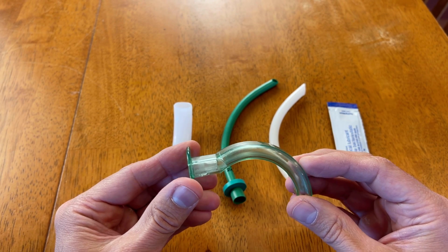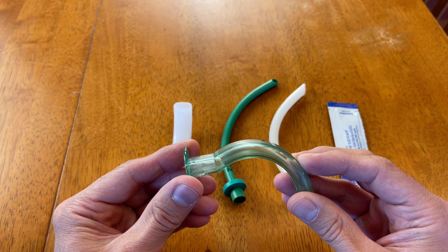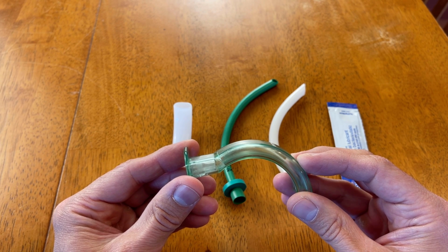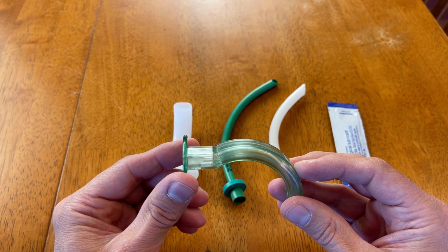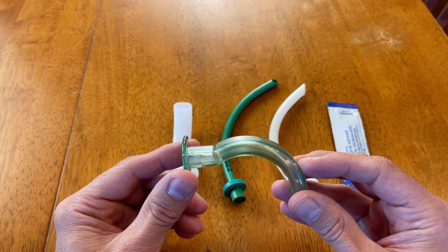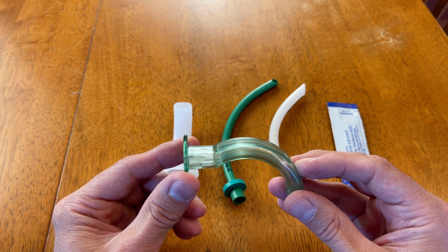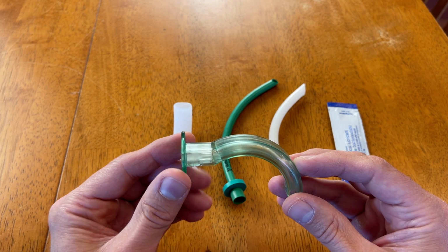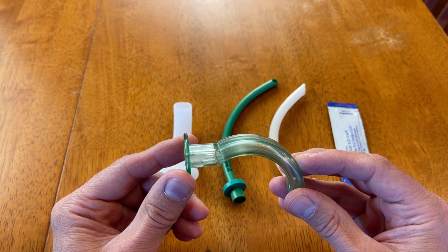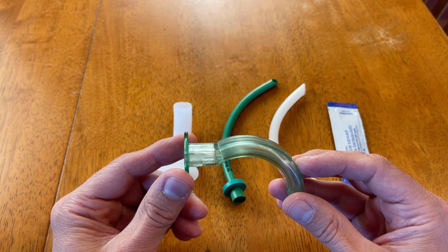Contraindications, just be familiar with that: patients, as I mentioned, with an intact gag reflex, patients with facial trauma or disrupted anatomy that will prevent this from seating properly, in which case this itself may become an obstruction to the patient's airway. Certainly if there are foreign bodies in the oral cavity, we want to remove those before inserting these. And once again, just follow your agency's guidelines on the proper use of the NPA and OPA.